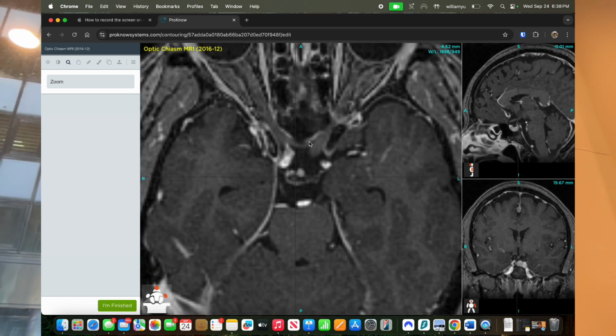And then you can see the optic nerve coming down here. And this must be the optic chiasm sitting above the sella turcica. So I'm doing all this for the first time, and part of these challenges are you don't see these images before you do them, so let's see how well we do.